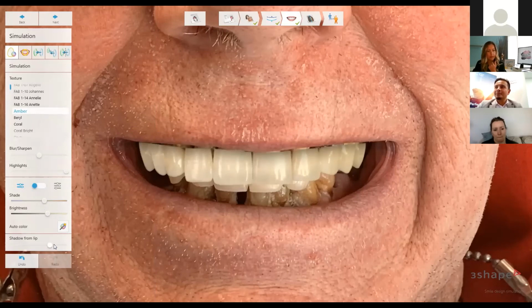This is a pretty nice feature here. It just creates things a little bit more natural. You can see on my arrow, do you see this little junction here? That's because I'm rushing through. You can tidy that up, you can go back and crispen up that first line where you're carving out the display area. So that'll give you a cleaner version.